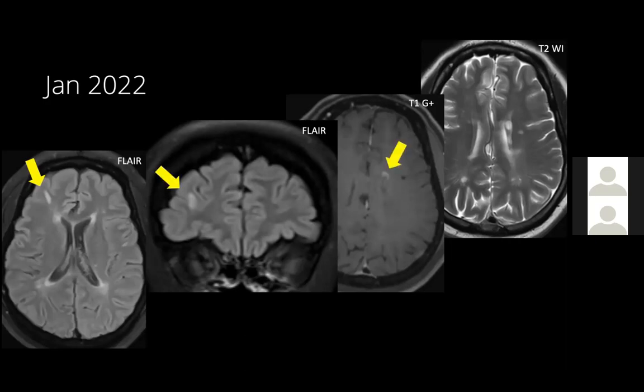So we sign out this case as symptoms typical for MS in the correct clinical setting.